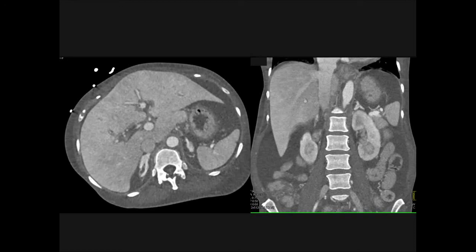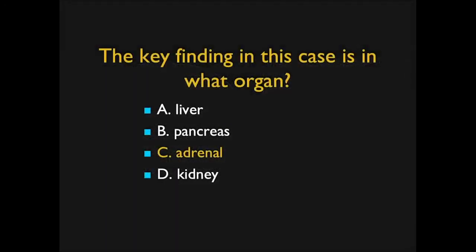The patient's hypotensive. Classic appearance. Very bright adrenal glands without mass effect in any of the limbs. That's classic for hypotension. A very important diagnosis. In many cases, we can make the diagnosis before the clinicians are aware of the diagnosis.